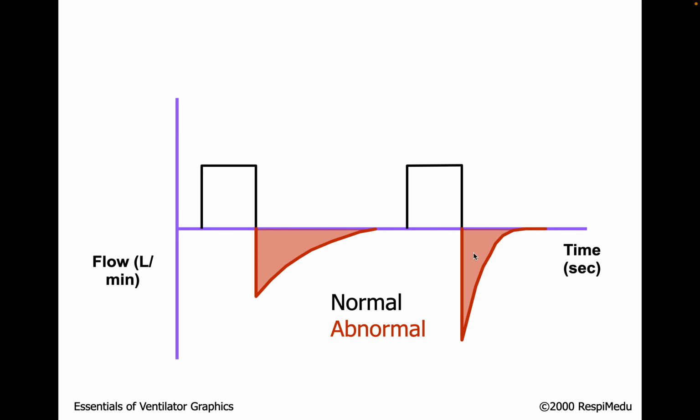And in this particular situation the highest negative point is more than that of normal. So you will be asked in the exam to identify the abnormality. Obviously in the first scenario the PEFR is low, so this is a case of obstructive airway disease, and in the second situation it is a case of active expiration.